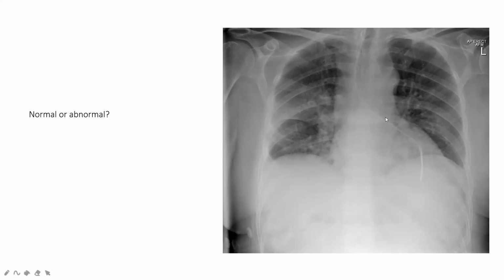So this is actually following, as you can see, it's kind of parallel to the left bronchi. So it is following the course of the bronchus. This NG is actually in the left lung. Although you can see the tip underneath the diaphragm, but again, thinking back about those 4 rules, 2 of them apply here.